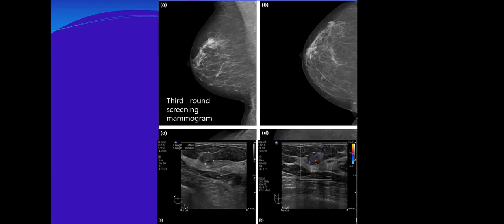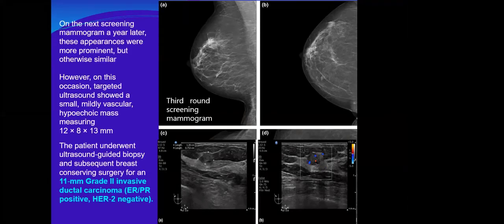I will make it BIRADS 4C, or 5? I don't know. This is from the literature, and I don't know how they describe it, but for me, I will put it as BIRADS 4C for biopsy. And let us see.